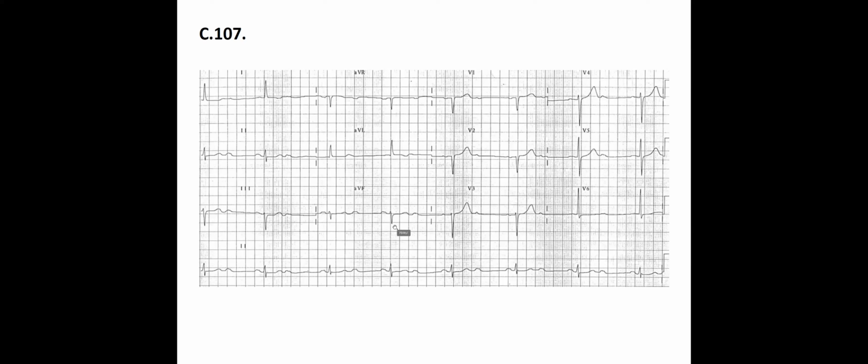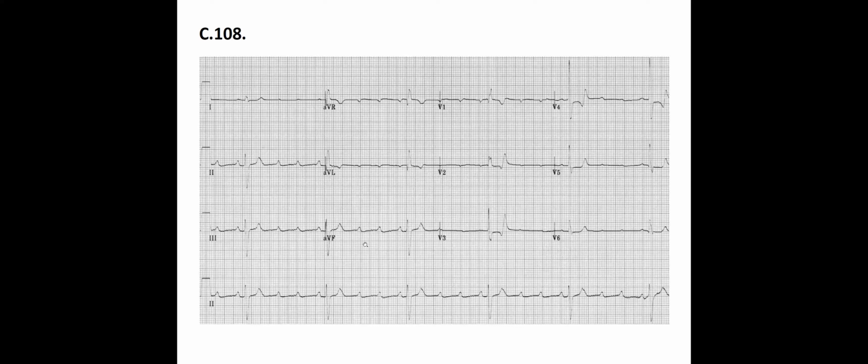Oh, okay. So 2-to-1. Only one thing that you do see, that the P wave is a little bit wider. As you see here, I show you it's here. That's a P. That's a wide P. And that can represent an atrial enlargement, especially the left atrial enlargement. But later on, we will learn it. Okay. But it's not a normal P for sure. Okay, thank you. Okay, good.